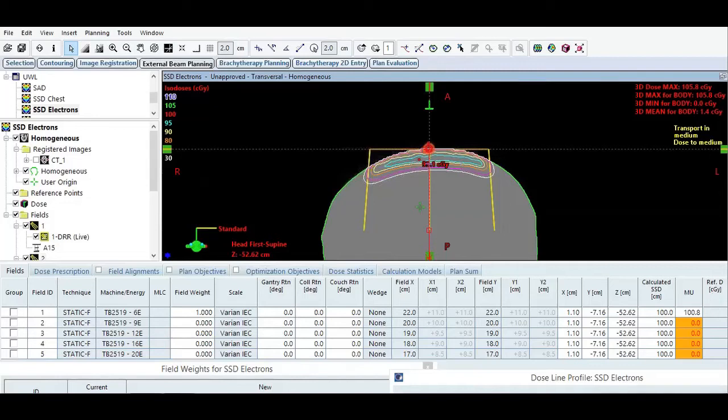I have set up a little clinical example of electron fields in the treatment planning system. I've used a body phantom called a Rando phantom, which is an epoxy with a simulated bone material embedded in it, but I basically overrode the density to that of water, just to negate any sort of variance we might have with heterogeneities.